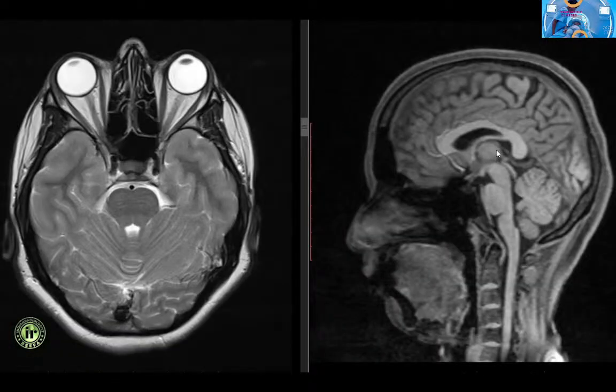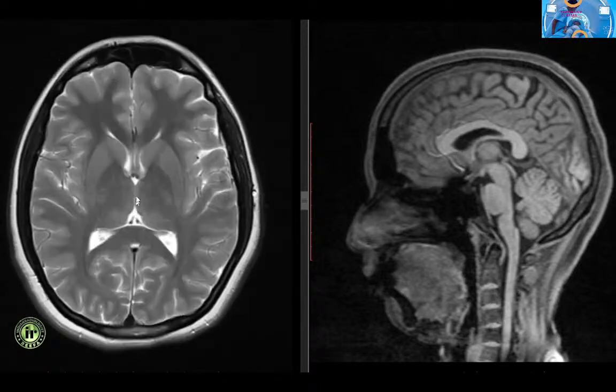The thalami are olive-shaped paired nuclear masses forming the lateral walls of the third ventricle. They are opposed in the midline at massa intermedia or interthalamic adhesion and are separated from the lentiform nuclei by the posterior limb of the internal capsule. The pulvinar projects over the midbrain.